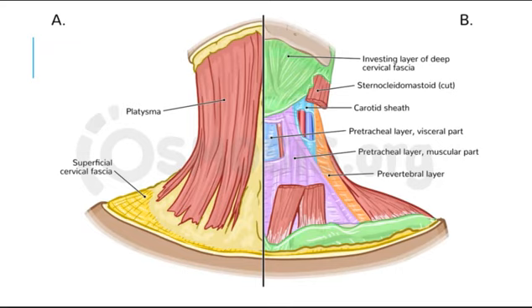As an overview of our information, we have layers in the neck, and most superficial is the fascia, and then underneath it the platysma muscle, which is very important in our first entity, the cutaneous and subcutaneous conditions of the neck. And later on we have the deep fascia, the deep cervical fascia, which also has superficial and deep parts, and in here it's mentioned as the investing layer of the deep cervical fascia.